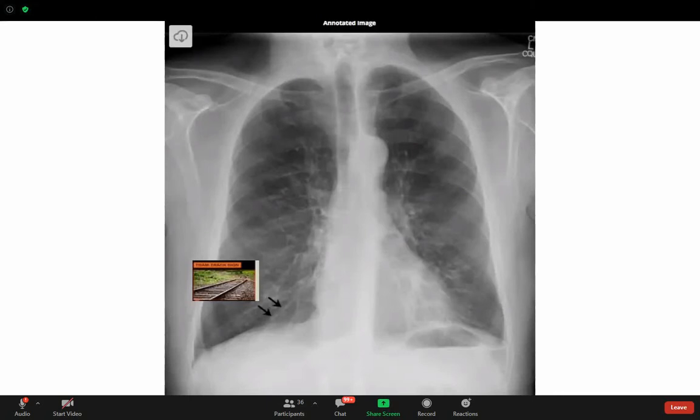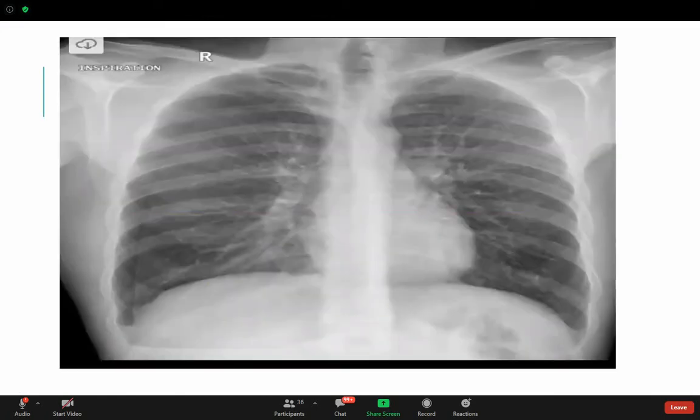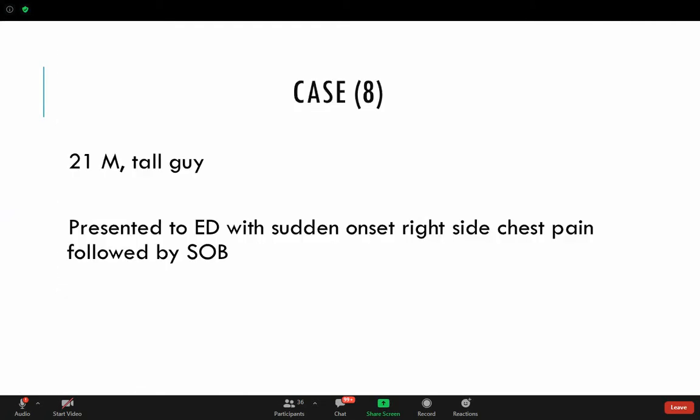Please go over the X-rays and see other normal and other variations, because don't expect all patients to have exactly this kind of pneumothorax. Sometimes they're only going to have it on one side. Sometimes it will be contained in the upper part, because don't forget it's air, so air usually accumulates in the upper part of the lung, as well as with pneumonia. You will have tons of examples for pneumonia, so get your eyes trained for that.